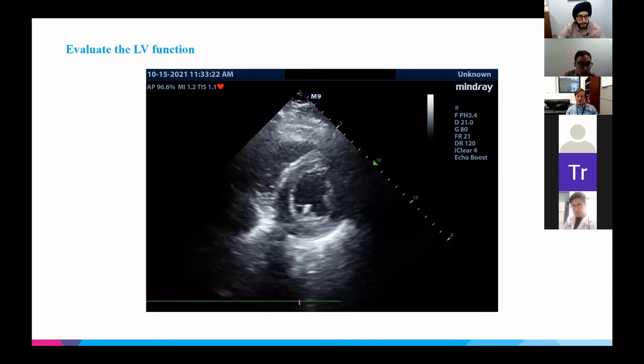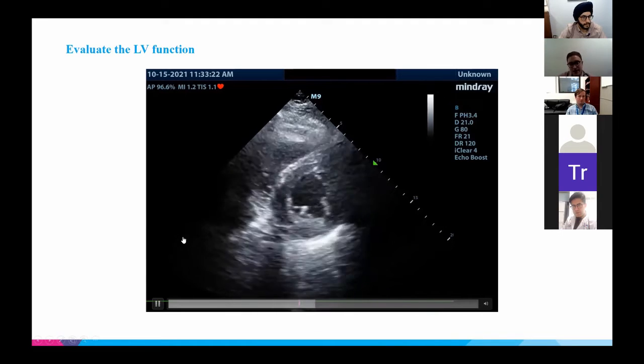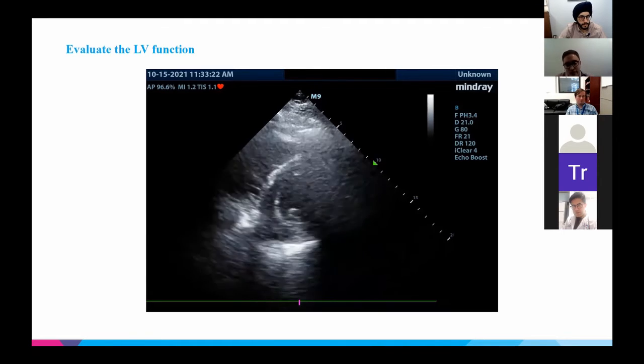All right. So yeah, I would say the majority of you ended up going with reduced, and then a good amount said severely reduced. I think it's tricky, right? So you may think that something doesn't look normal. It's sort of just a question of whether you think there's enough movement for it to be mild or moderately reduced, or not enough movement where you want to say severely reduced.